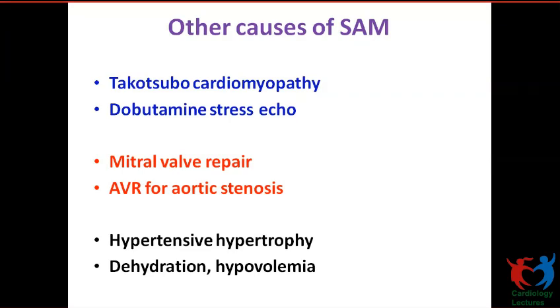Here the movement of the mitral valve peaks with the peak of posterior wall movement. It is classically seen in large pericardial effusion, mitral valve prolapse and hypercontractile states.